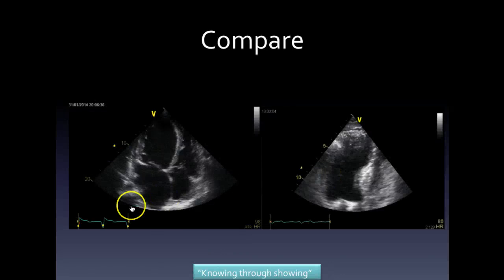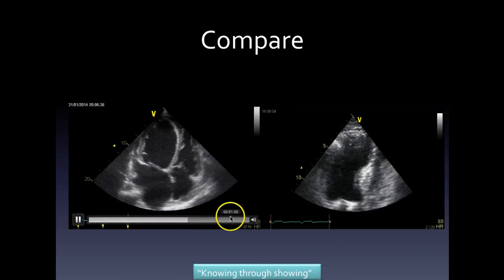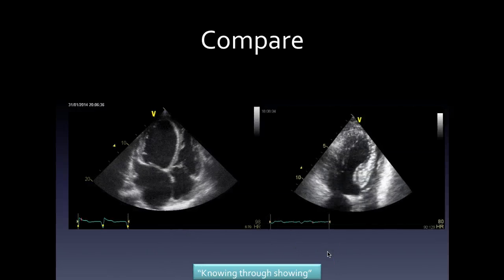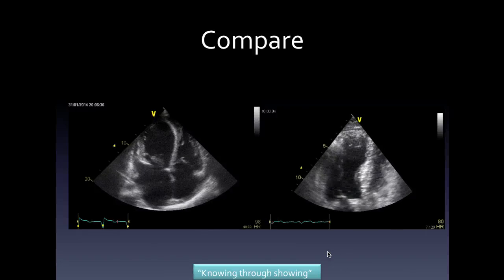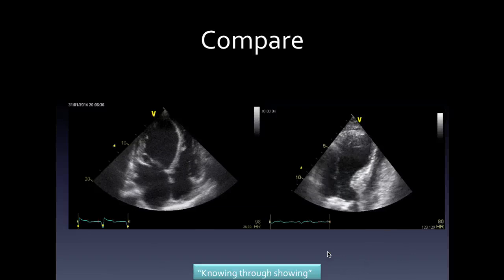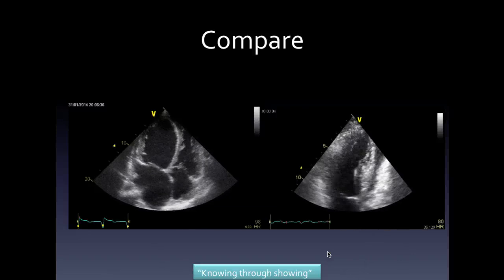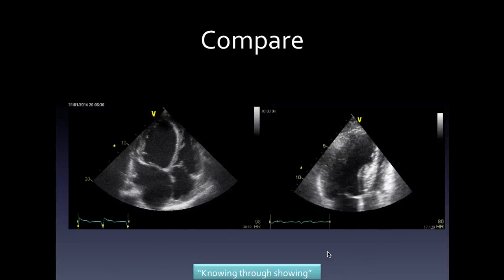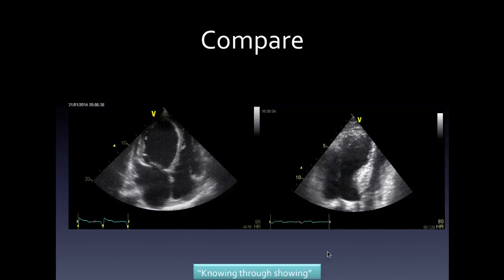So then, just to compare those two cases, if you look at patient A and patient B, when you put them beside each other, you do see a big difference, don't you? Both patients have this almost frenetic vigor. It's moving, isn't it? But it isn't thickening. This one has frenetic vigor, but it thickens as well.